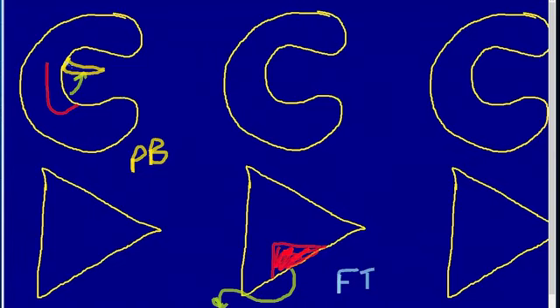Both of these cases could be described as a flap tear because they're both flaps, but I think this one in particular along the inner edge, where it creates kind of this shark fin-like appearance, is more conventionally termed the parrot beak tear, whereas this tear that's kind of sheared off of the inferior or superior borders of the meniscus and gets displaced into the gutters is more commonly called a flap tear. So I wanted to show examples of this phenomenon just so that you've seen this on MRI.